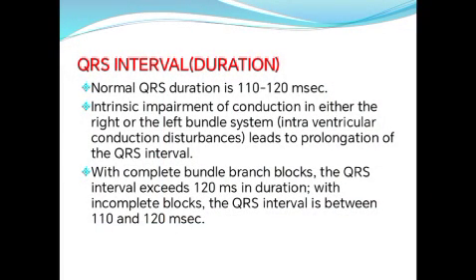Okay, we are talking about the intervals now, so we can talk about the QRS interval or duration. The normal QRS duration is from 110 to 120 milliseconds. We can say milliseconds or seconds. If we say seconds, we say 0.11 to 0.12 second.